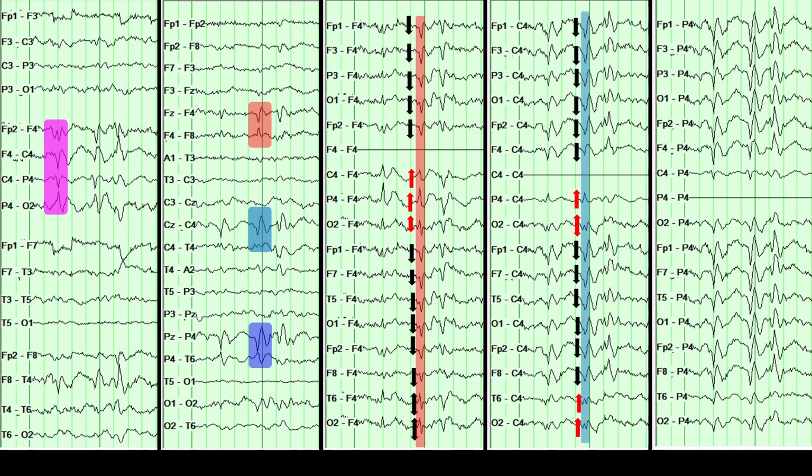Now I have introduced the new epoch with a new montage. This time I am using P4 as the common reference electrode. Remember that P4 has been the highest most negative potential in the other two prior epochs, thus now making the P4 electrode the best candidate for the maximum of the field.